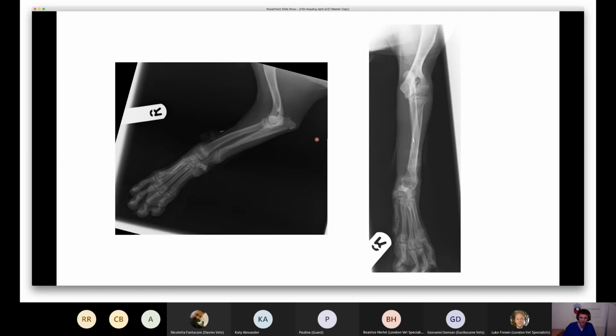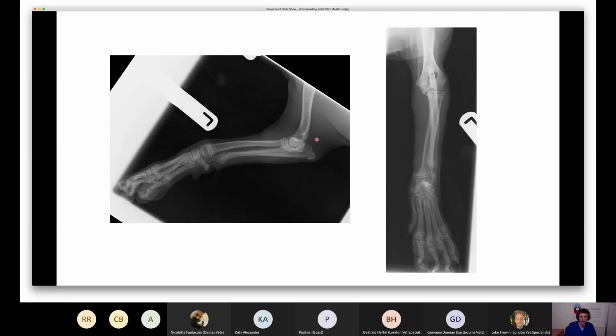I mean, can we completely rule that out on these radiographs? Not completely. Looking at the left one and comparing, I'd be more convinced it was just superimposition of this physis, but I think it'd be a reasonable thing to include in the report, certainly.